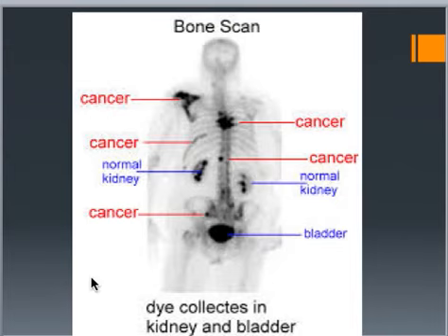And remember I said that some hot spots are usually bright white? Well, these ones don't look like that because the image itself is white. You'll see some later where the images are darker and the hot spots are white. But like I said, this is a bone scan. Sometimes it's the full body, sometimes they won't get the legs. Just depends on what they're looking at.